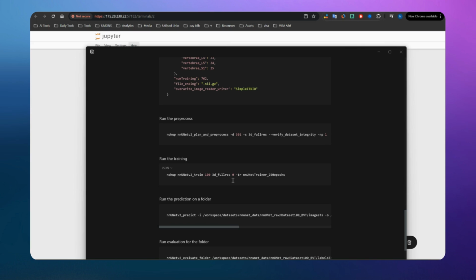So it depends on you whether you want to use some of your training datasets for the validation, or use all of them. Because if we select 0, which means we take 1/5 of the dataset, this 1/5 will be isolated. It will not be used for training, but only for validation. But if you use all, then all of them will be used for training and validation. Okay. Then the next argument, which is the trainer.